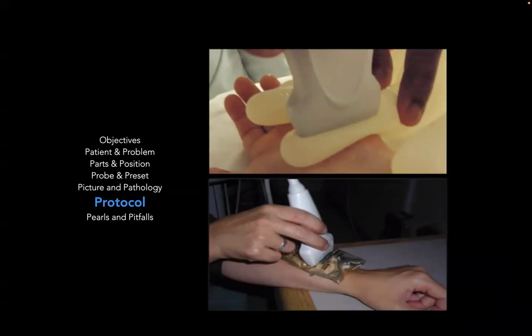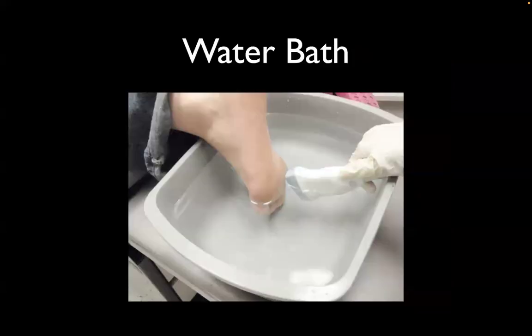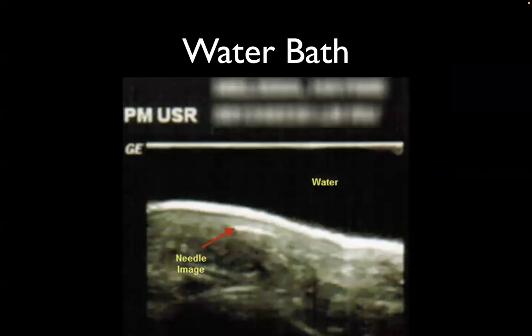In pediatric patients, if they're worried about pain or in discomfort and you don't want to push too hard with the probe, you can also use other ways of scanning a place where it really hurts. You can use an IV bag with gel on top of the IV bag and on the bottom of the IV bag, and that way you can scan through the bag into the area of interest. Or, for example, a water-filled glove. And again, a water bath to look at foreign bodies. So for example, in this image here, this is the foreign body that's seen in the soft tissue.